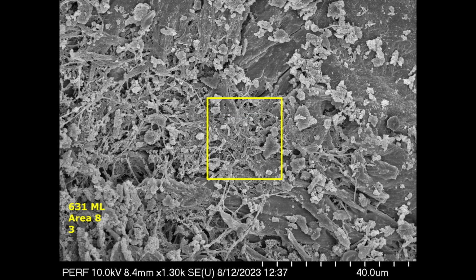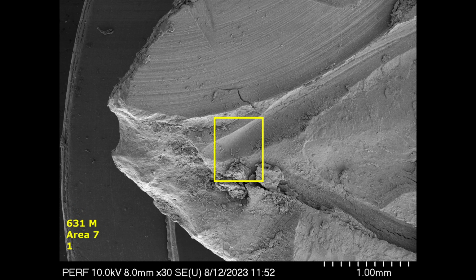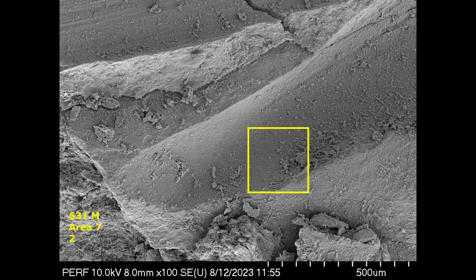We have no way of determining from the imaging whether these are viable biofilms or not. All we can say is they do not look like biofilms one sees in conventional irrigation cases. In the mesiobuccal canal, looking at the terminus area, where it appears the instrumentation has been much more definitive, the canal wall is clearly seen and appears very well debrided.